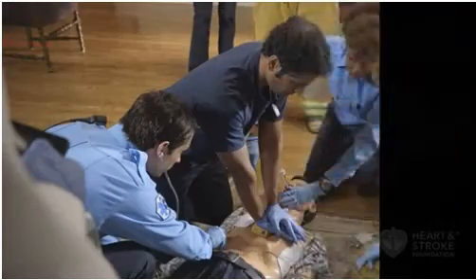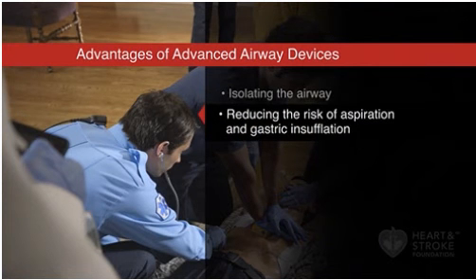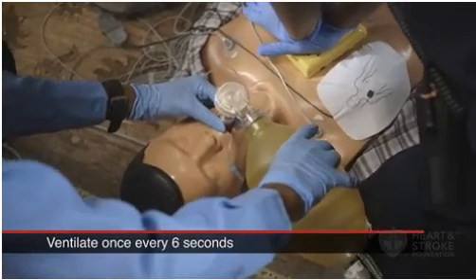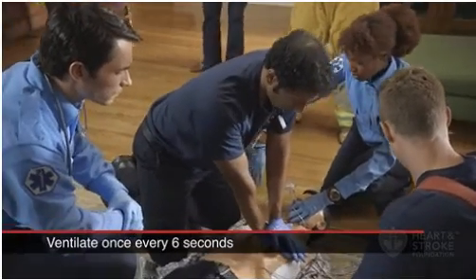With careful attention, trained healthcare providers can use an advanced airway to safely provide ventilation that is as effective as bag mask ventilation. Advanced airway devices offer many advantages. These include isolating the airway and reducing the risk of aspiration and gastric insufflation. After inserting an advanced airway during CPR, providers should deliver one breath every 6 seconds without interrupting chest compressions.